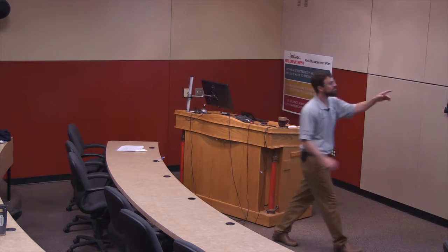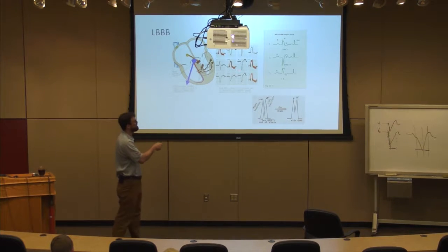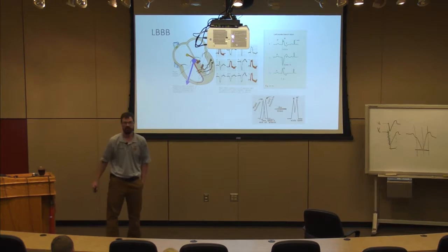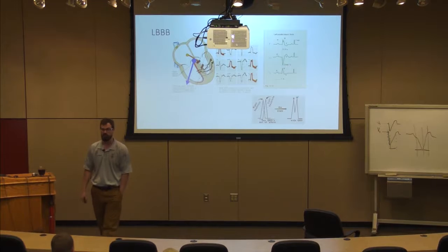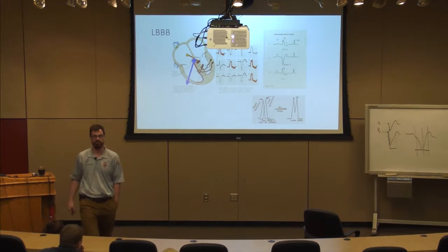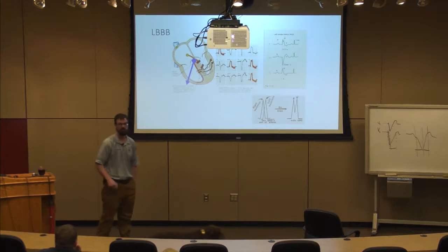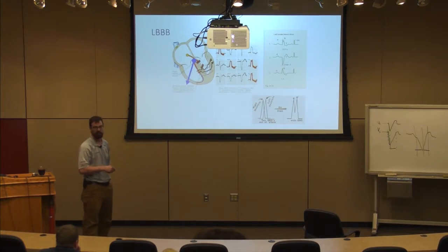So we look at these precordial leads for right bundle and left bundle. Big, wide, and down is my left bundle obvious sign. I look over at V6 for my supporting sign, and I can sometimes see rabbit ears, but more importantly, I never have a Q wave in V6 with a left bundle branch block. You don't get a Q wave. So: absence of a Q wave with a downsloping big R wave in the precordial leads.